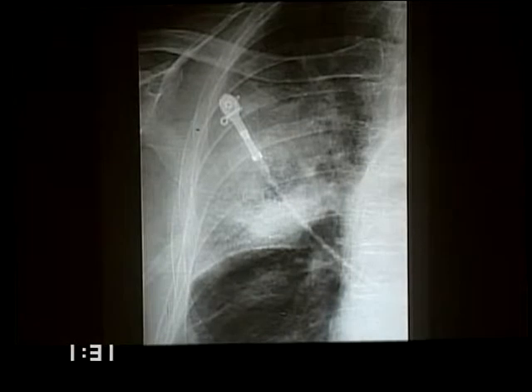Finally, we'll deal with airspace disease that undergoes central necrosis. This is a portable X-ray from the intensive care unit. This, at autopsy, which was performed just a day or two later, had a large central cavity.